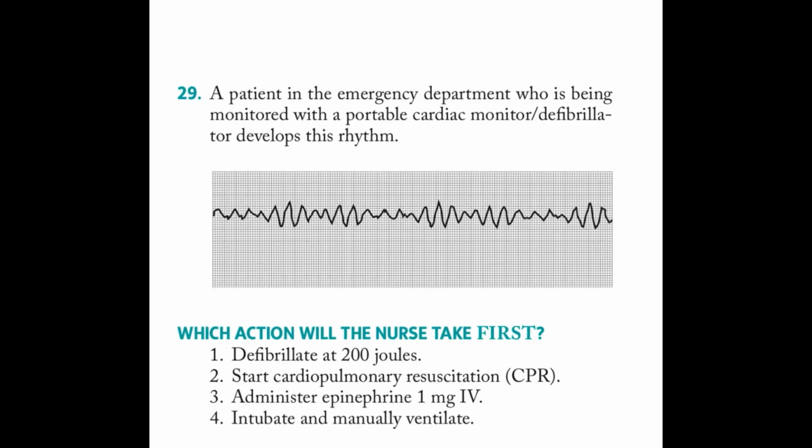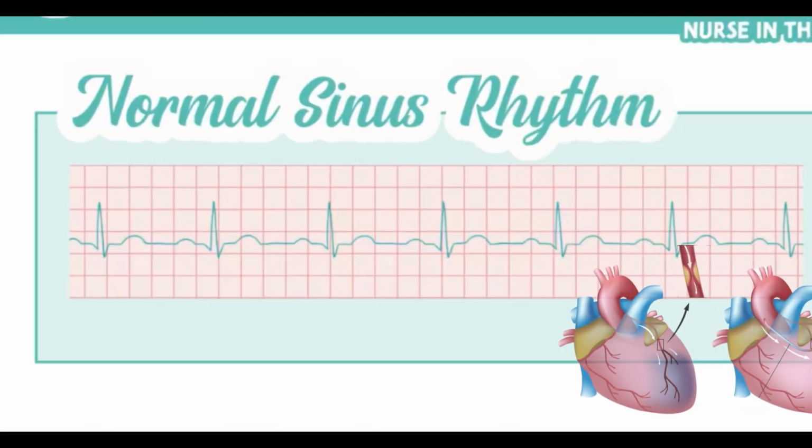So, this type of question you see in the NCLEX exam. To solve this question, you should know what type of ECG rhythm it is.